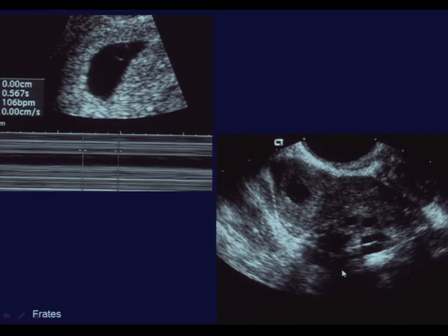This patient was taken to the operating room, and an ectopic pregnancy was not found. And I'll point out a few reasons why an ectopic pregnancy was not found, despite the fact that this ring is indeed more echogenic than the ovarian parenchyma. If you look carefully at the edge of the ovary, you can see that the ovary continues all the way out here. And this is clearly an intra-ovarian lesion.